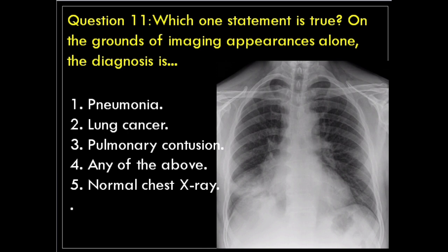Question 11: Which one statement is true? On the grounds of imaging appearances alone, the diagnosis is: 1. Pneumonia. 2. Lung cancer. 3. Pulmonary contusion. 4. Any of the above. 5. Normal chest X-ray.